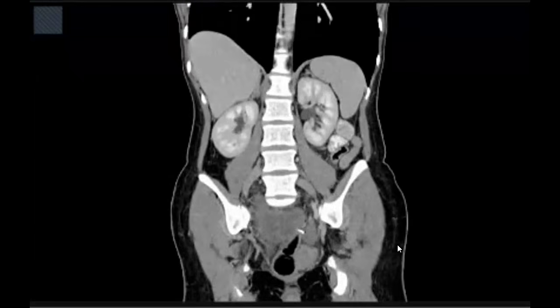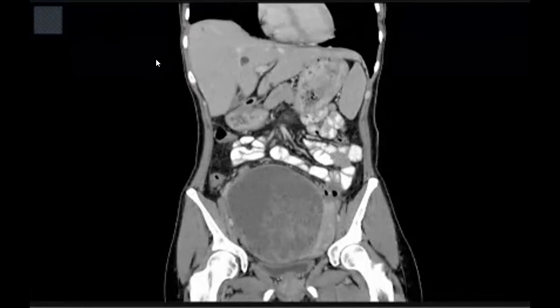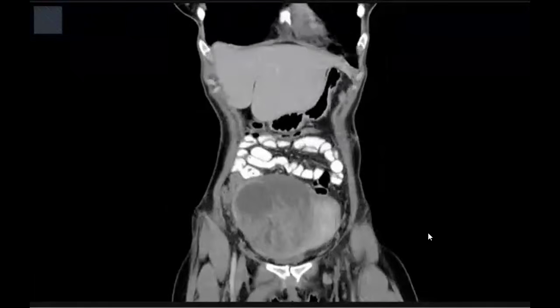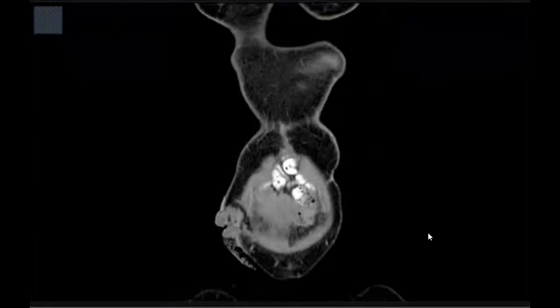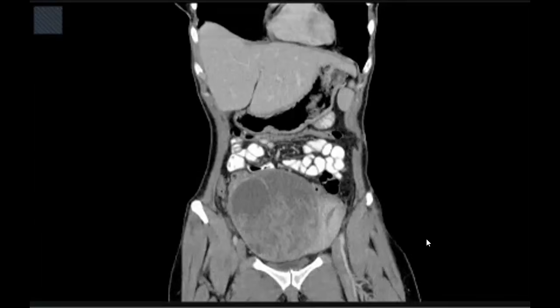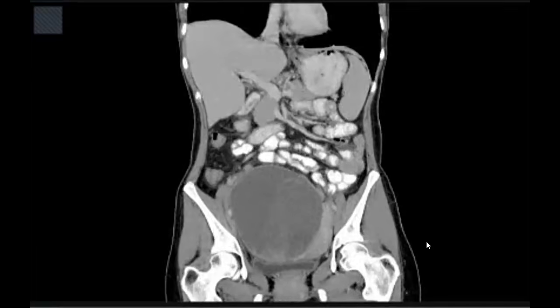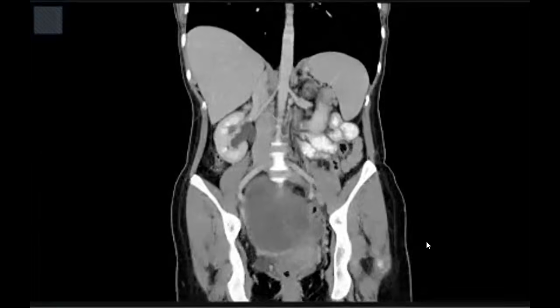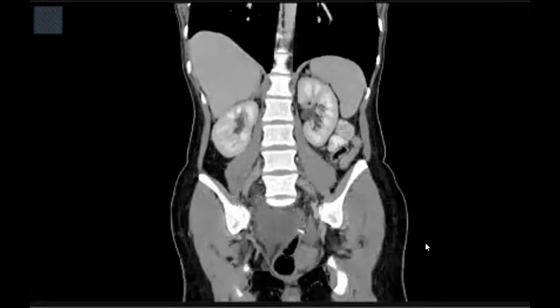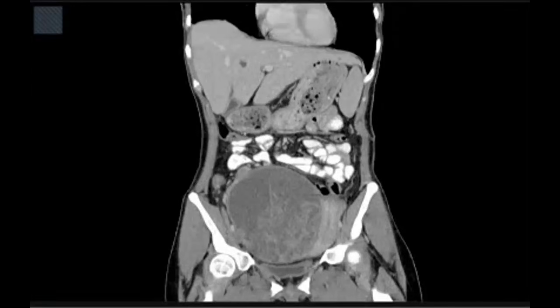I will put a differential for a cystic lesion with enhancing septa and nodularity inside. First differential, I would put serous cystadenoma. Other differential is mucinous cystadenoma. In my daily practice, I want to check other views and read them, if any.